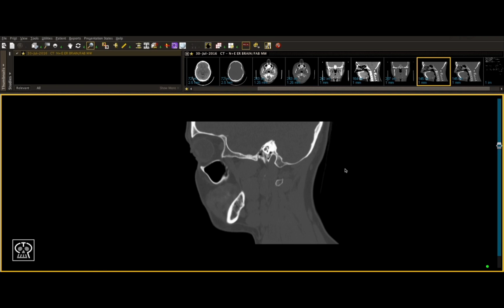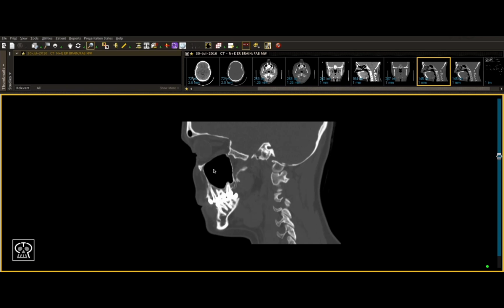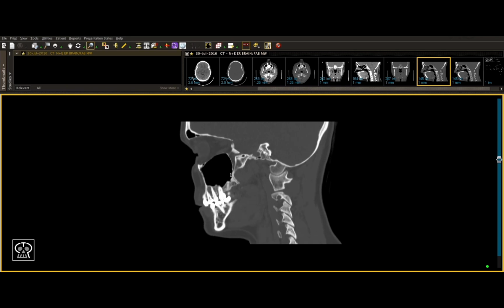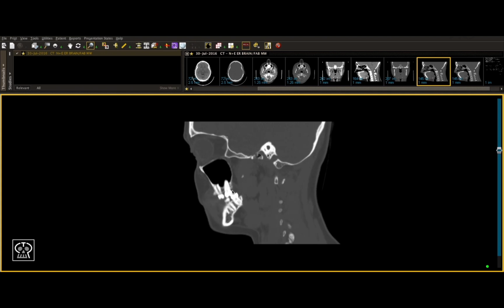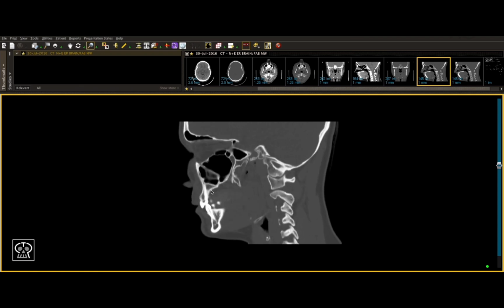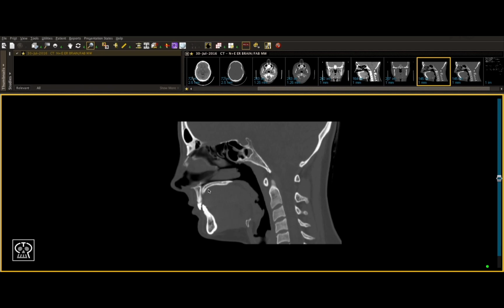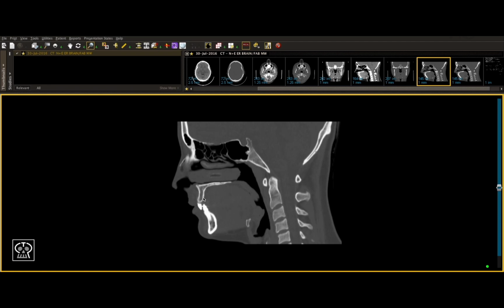Starting from one side, you'll immediately see the maxillary sinus come into view. As you can tell later on, this will be a great view to analyze orbital floor fractures. However, when it comes to the maxillary sinus itself, analyzing it from the axial view is usually much more useful. One advantage of the sagittal view, however, is when it comes to dentoalveolar fractures. Because you're seeing all the teeth in the alveolus in the sagittal plane, you're able to visualize alveolar fractures in great detail, as well as tell where they are relative to the teeth.